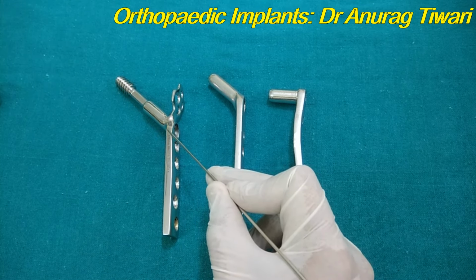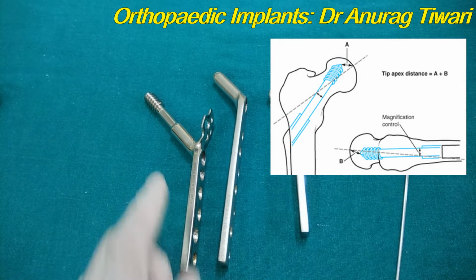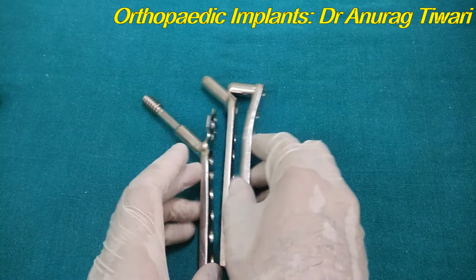The second thing you must know about the DHS is the TAD, the tip apex distance. You measure the tip of the implant and the apex of the head of the femur, the center in the cartilaginous portion. If you measure this distance in the AP and lateral views, the sum of the TAD, AP and lateral, should be less than 25 mm. Then only will it not fail. If it is more than 25 mm, the failure rate of DHS is high. So this is all about the DHS, the sliding hip screw assembly.